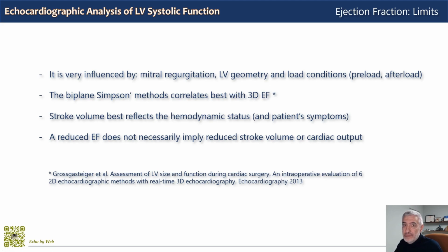A constant commitment to the task of measuring the planimetries and ejection fraction will deliver accurate and also fast measurements of ejection fraction.